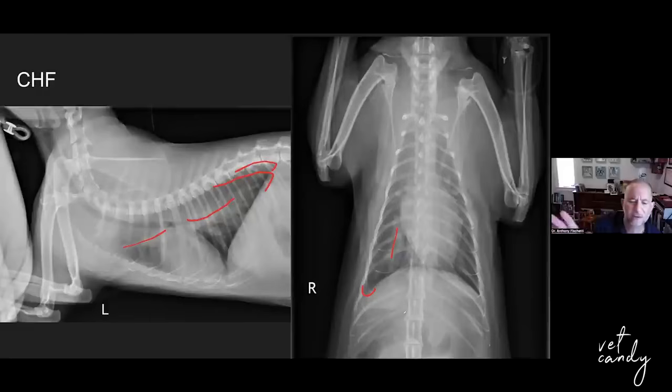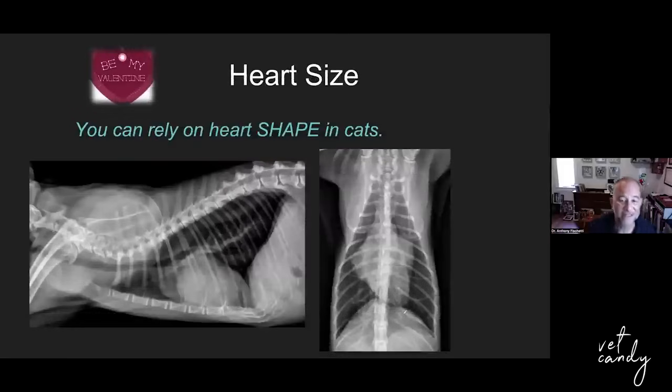You actually very rarely, if any time, see it with just mitral valve degeneration. You will see it with right-sided enlargement and right-sided congestive heart failure, but the pleural fluid tends to be mild relative to the peritoneal effusion. Okay, so for now, just remember, whenever you've got pleural fluid in a cat, one of your differentials should always be congestive heart failure. It certainly helps in this case since the pulmonary blood vessels are so large and the heart is so large.